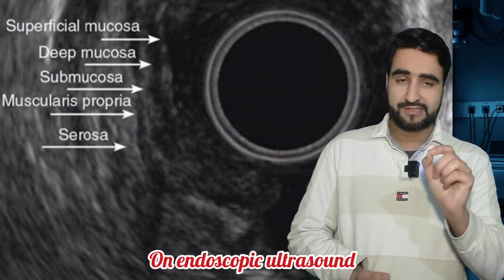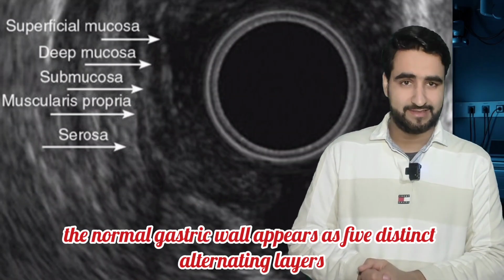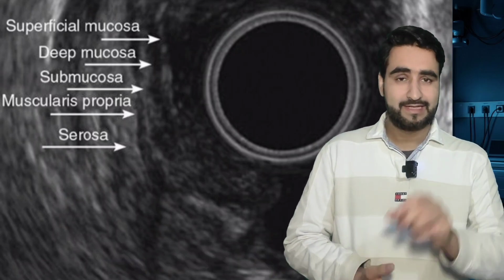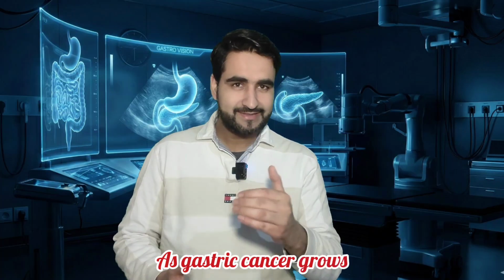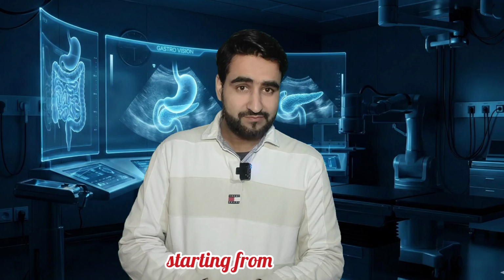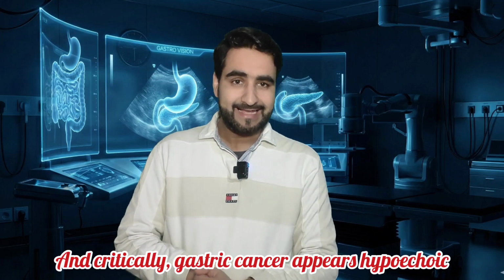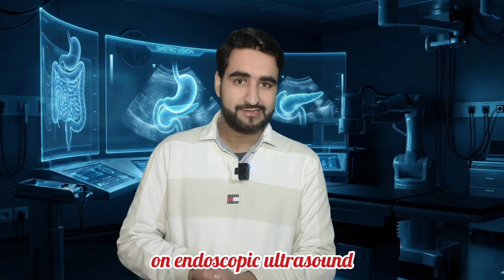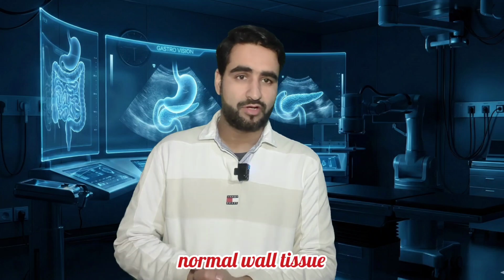On endoscopic ultrasound, the normal gastric wall appears as 5 distinct alternating layers: hyperechoic and hypoechoic bands, each representing a specific anatomical layer. As gastric cancer grows, it destroys this layered architecture, starting from the mucosa and advancing outward. And critically, gastric cancer appears hypoechoic on endoscopic ultrasound, making it stand out against the surrounding normal wall tissue.